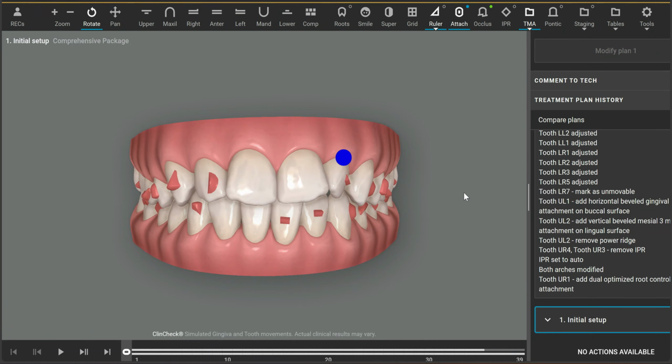I'm founder of Invisalign. Have you ever had a case come back and there's just way too many aligners in a treatment plan they sent you, and you're kind of going, gee, is that going to really take that long? And you really don't know what to tell the patient. Perhaps there's a treatment consultation pending. In this particular case, I want to show you a case that I did about 10 minutes of 3D control work on, ran live update, and you'll see a significant reduction in the number of aligners. Let's look at this case.